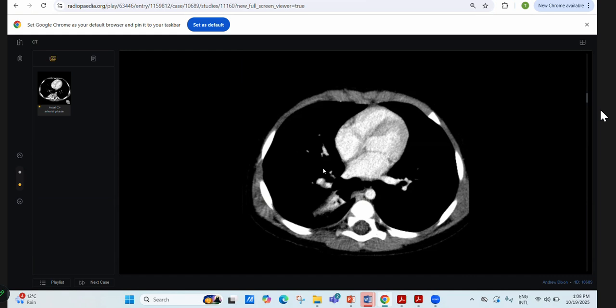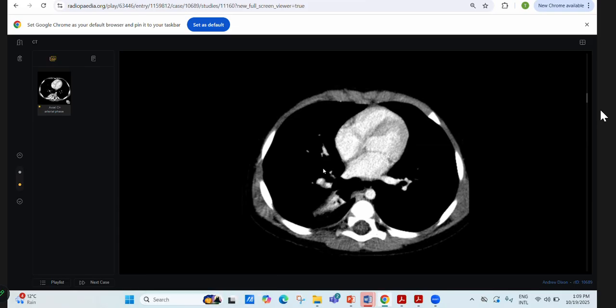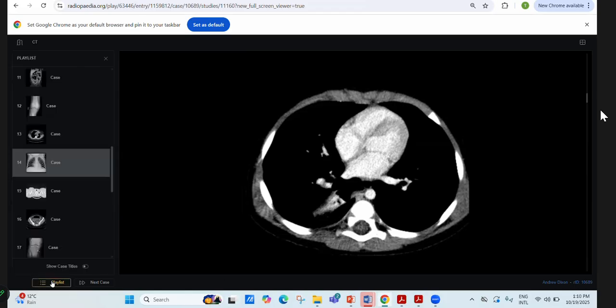Number two is that when I give you history of a recurrent chest infection in a young patient with a chest X-ray, always remember sequestration, because a typical history they will definitely give you. Without that, it's impossible to reach the diagnosis. You will also always say it's like a pneumonic patch there, and obviously, if it's recurrent, you will go for CT scan. Otherwise, in children, you don't go for CT scan so easily and quickly. But in a child with recurrent chest infection, you have to go for it. And candidate one, you did really well in this after looking for the vessels and everything. Yes, it was right. So this was the sequestration.